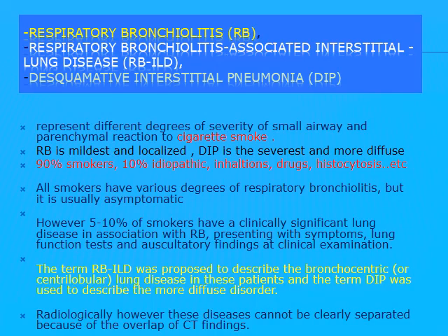The next category is respiratory bronchiolitis, respiratory bronchiolitis associated interstitial lung disease, and desquamative interstitial pneumonia. These three patterns represent different degrees or a spectrum of severity of a small airway and parenchymal reaction to cigarette smoking.